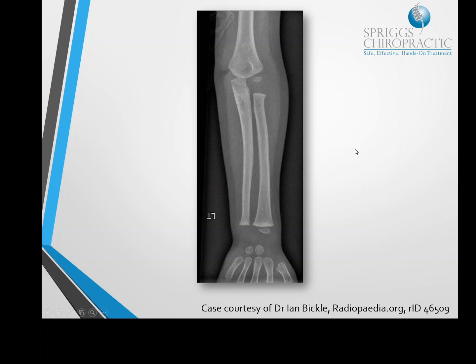This is a PEDS case. This is just to show you the difference between an adult and a pediatric case. I will take you through some PEDS today as well, just so that you've got a full understanding of everything that goes on, and you can understand exactly what we're dealing with when you start getting into PEDS. If you start going down the road of PEDS, it is an incredibly difficult area, a real specialism. It's fascinating to see, and it's always very handy to know, but it can become very daunting when you start getting into PEDS trauma in particular.